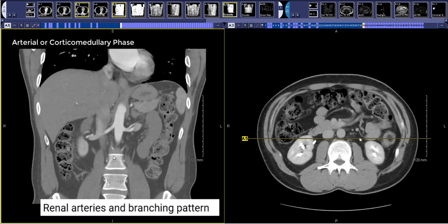For example, I've seen cases where there were 3, 4, or 5 arteries supplying an individual kidney, and that makes them basically unable to be donated for transplantation. If you have 2 renal arteries, sometimes the surgeons will do it and just do multiple anastomoses, but once you start to get to 3 or above, it usually makes donation not possible.